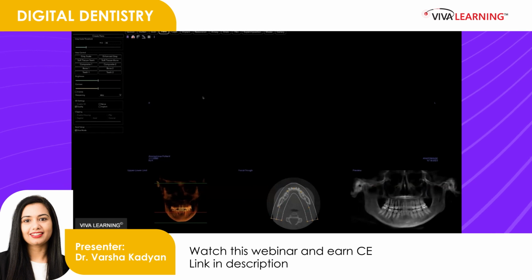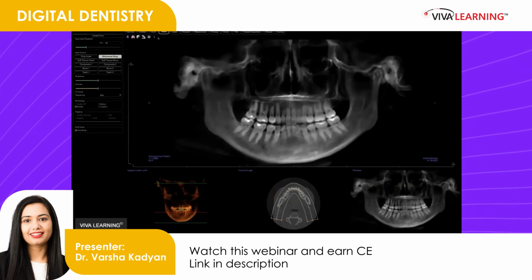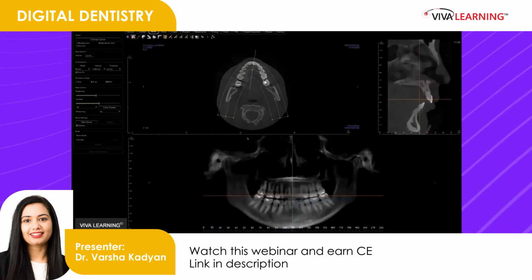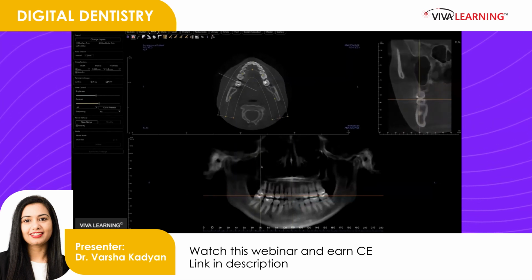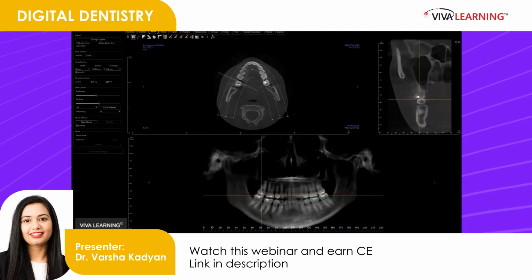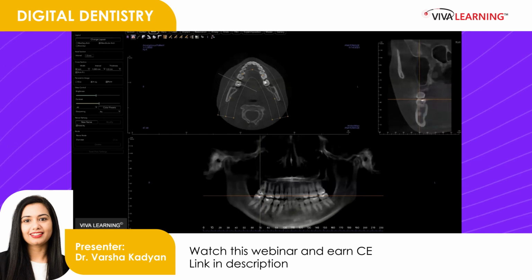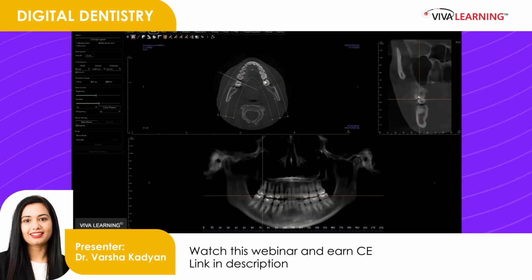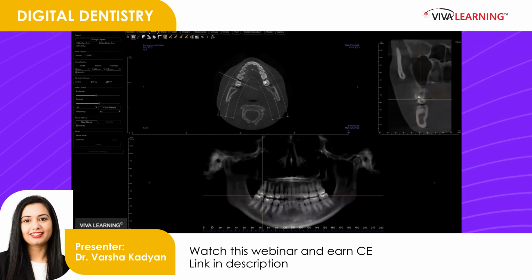You can create a reconstructed panoramic image from your CBCT scan. And this is the panoramic image. What I usually do is scroll, and this is the cross-section area of this slice, where your cursor is at this point. So this is tooth number 2 and 31 in this area. You'll see this is your tooth number 2, and in occlusion is tooth number 31.